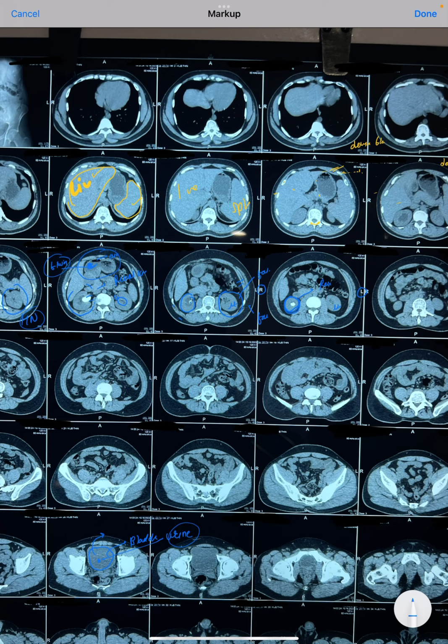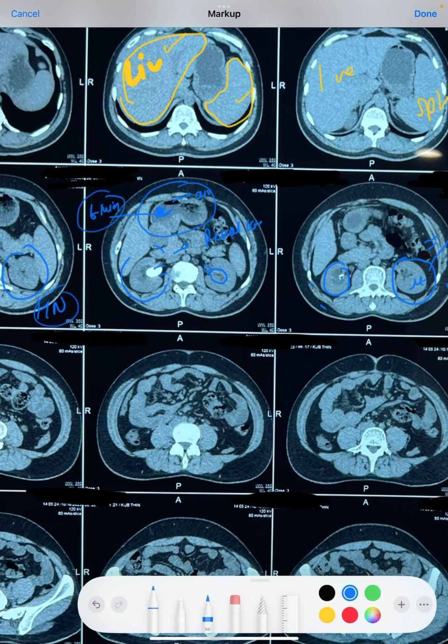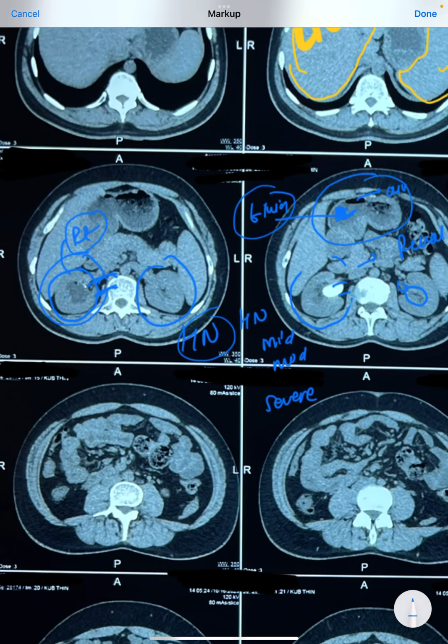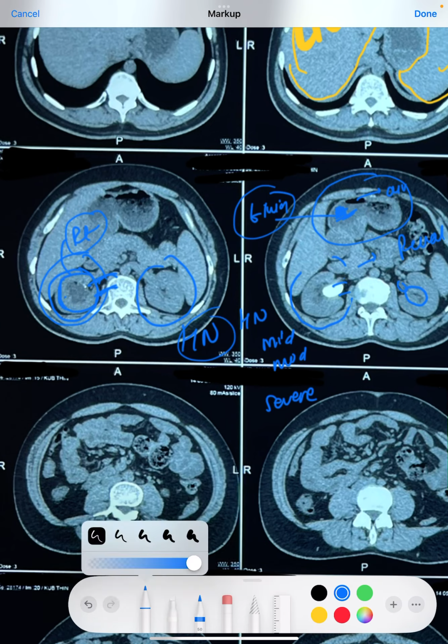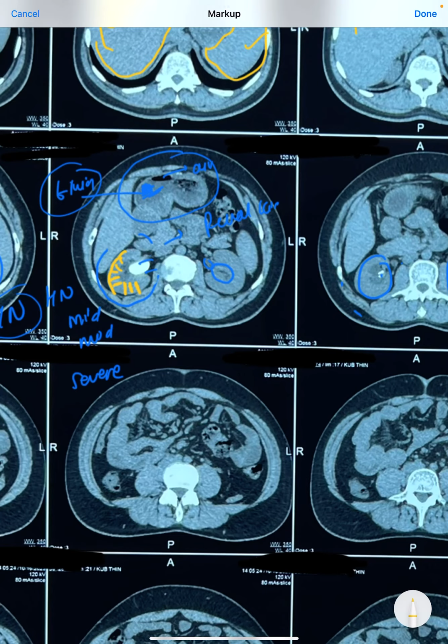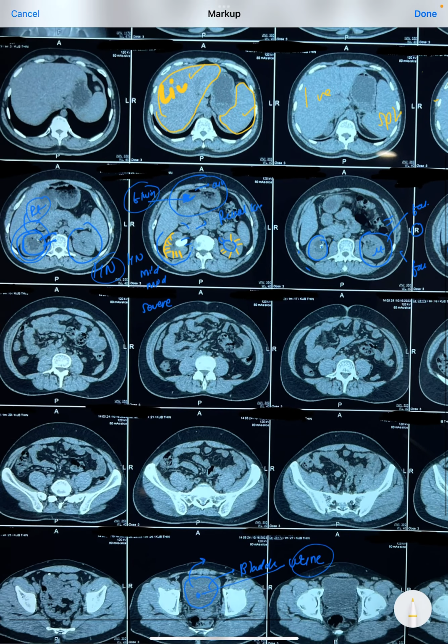The second thing is, when we zoom in, the other thing which I need to tell you is that hydronephrosis can be mild, moderate, or severe hydronephrosis. In severe hydronephrosis, there will be thinning of the renal cortex. The renal cortex, or the cortex of the kidney, will be very, very thin. But here the kidney cortex is pretty good. The kidney cortex has pretty good thickness, and it is almost as thick as the left side. So it is not at all a severe hydronephrosis.